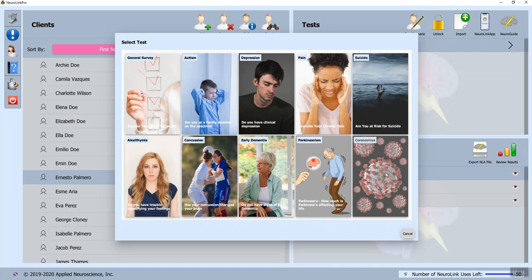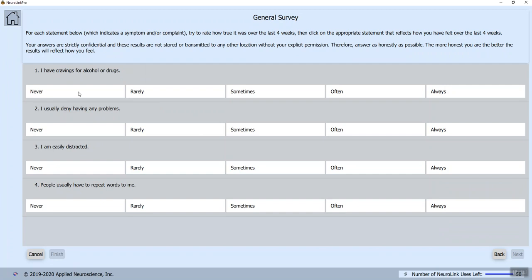We also have a coronavirus questionnaire that is dealing with the severity of the symptoms of coronavirus, just because this is a special moment. And in any case, these are all separate questionnaires that self-report the severity of the symptoms. I'm not going to go into this particular one at this time because I'm going to do that on the smartphone. I'm going to cancel.